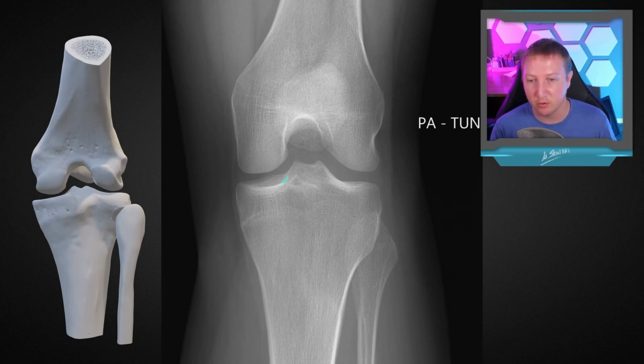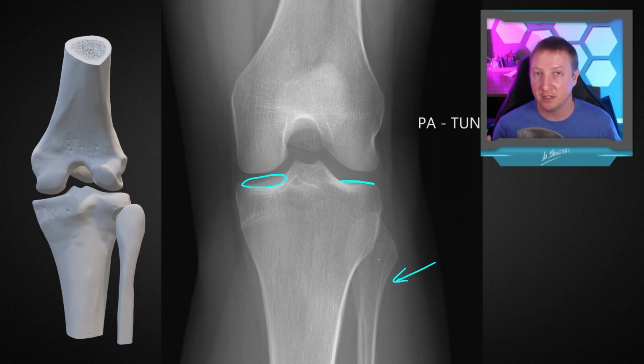And once again, notice that we're not seeing the tibial plateaus projected symmetrically here because they're not at the same angle. And then this is a case where I wanted to show you that fibula kind of having that T shape, as I mentioned, where we can see the cortex kind of coming out here, and then we see kind of these additional cortical lines. These aren't periosteal reactions or anything like this. That's just the kind of center portion.